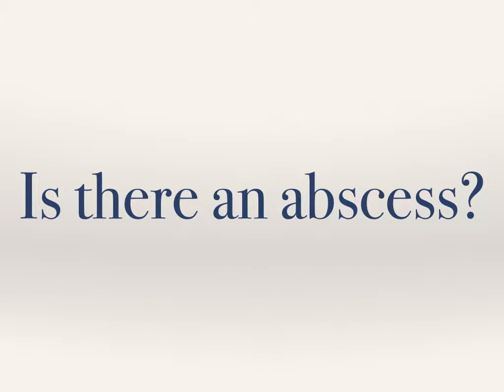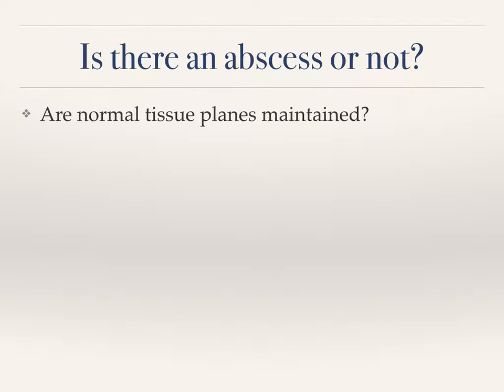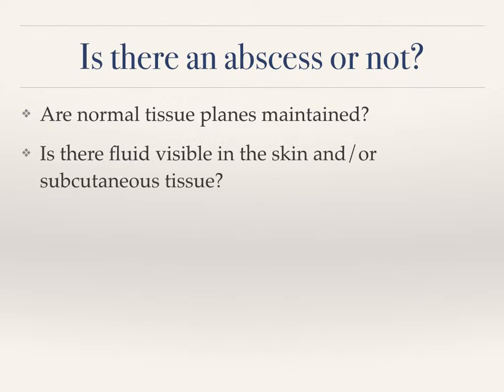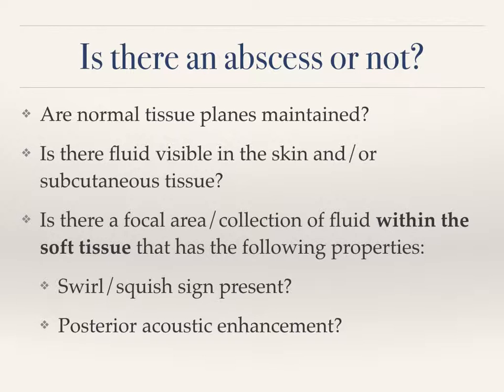Now, while this seems like a straightforward question, it actually requires us to answer a number of smaller questions. When asking, is there an abscess or not, what we really want to know is, are normal tissue planes maintained? Is there fluid visible in the skin and or subcutaneous tissue? Is there a focal area or collection of fluid within the soft tissue that has the following properties? A swirl or squish sign present? Posterior acoustic enhancement? And is there lack of vascular flow?